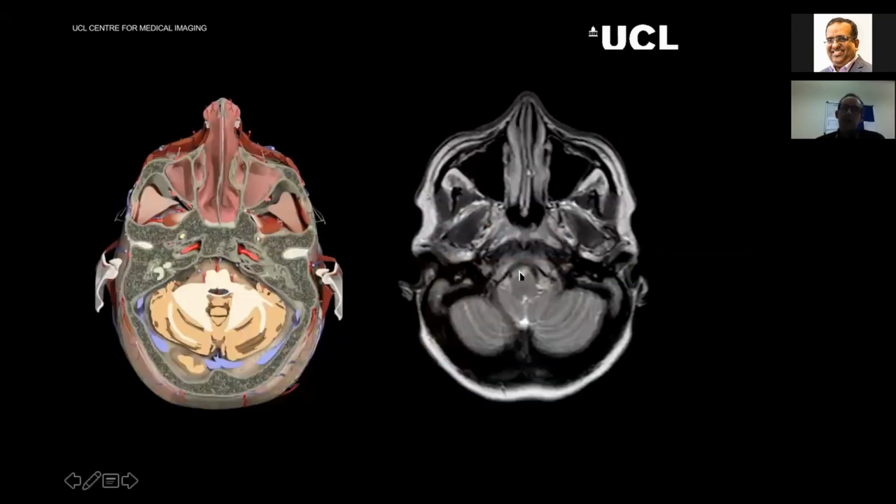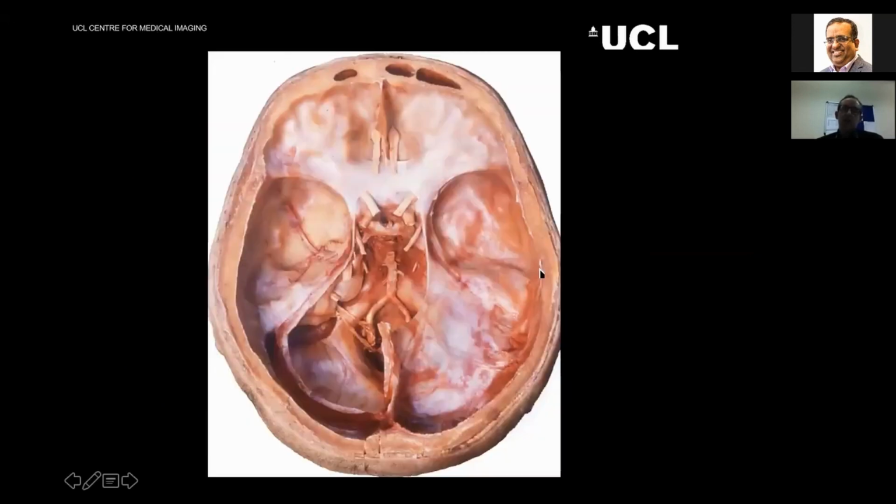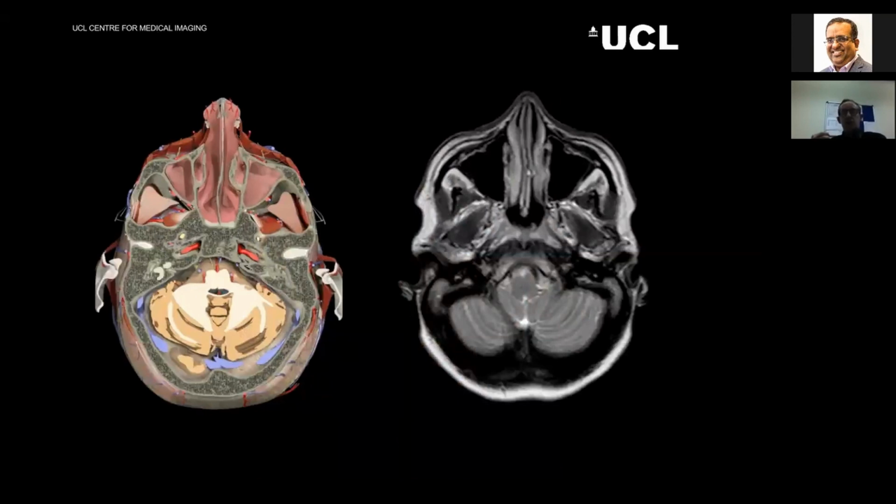And I'm going to draw your attention here. So in terms of sequences, this is obviously an MRI scan. And I think the first thing to be wary of is spending some time with colleagues and spending some time when you're looking at sequences to work out why a certain sequence is what it is. I say that slightly glibly, but when you're stressed, looking at a T1 weighted axial image of a brain and a FLAIR sequence, when you've been used to just saying, actually, it's T2 because the globes are bright, which has got you out of trouble year in, year out, is going to get you into trouble that way.